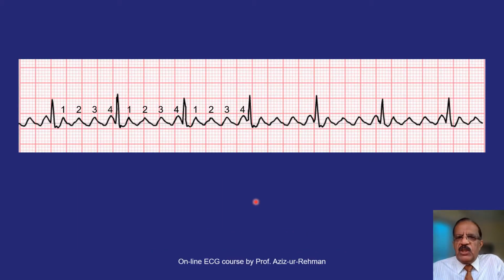Now this is the ECG, and it is not a 12-lead ECG, it is just one strip because we just need to study rhythm. What do you see in this strip? Suppose this patient has a history of palpitation. If you scan from left to right, what do you see? 1, 2, 3, 4. What do you think these waves are? These are P waves, right? Because you can clearly tell these are P waves.